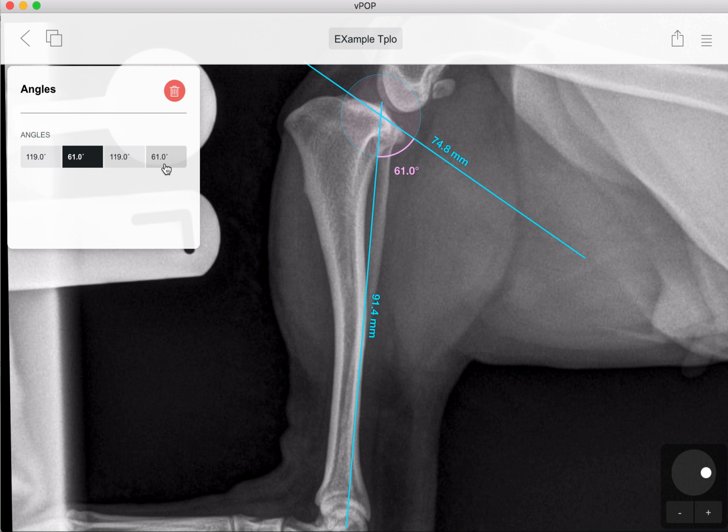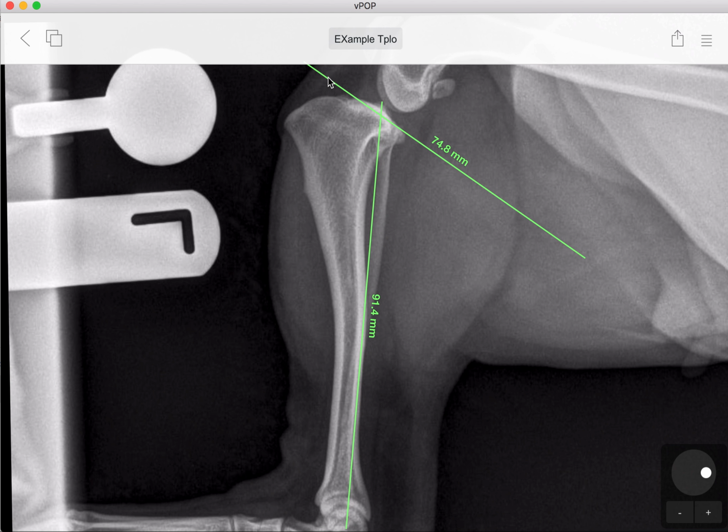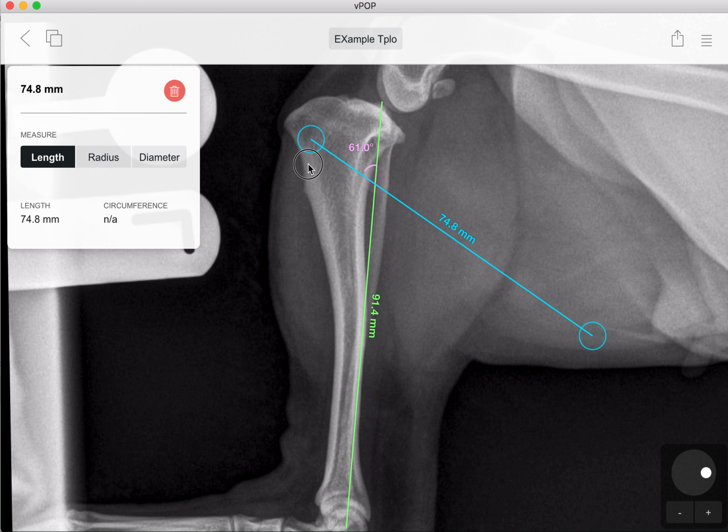We can use our rotation charts from there to work out what blade rotation we need, or what we can do is we can say, well, let's rotate to our target tibial plateau angle of 85 degrees here, which equates to a tibial plateau angle of 5 degrees post-operatively. So we're going to leave that there and then move that to where we want our intersection to be.